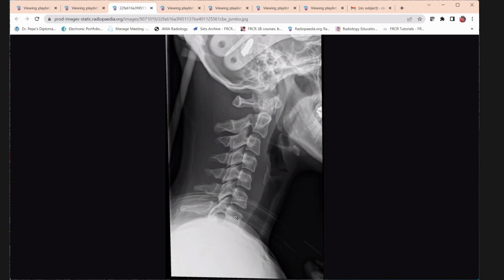Okay, so in the cervical spine or any spine per se, even if you are seeing a fracture, you would go for a CT, that we always do in routine practice. You did not ask for a CT, so I did not give you one. But for this case, you should have asked for a CT. Okay. Rest you had picked up in MRI.